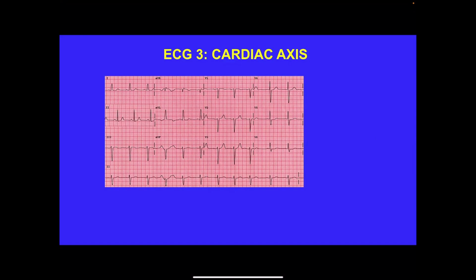This is normal. Normal, okay, exactly, because it's positive in lead 1, negative in AVF, but then we confirm with lead 2. And lead 2 is... Exactly. Yes. The thing with left axis deviation is that you can only confirm it by looking at lead 2.